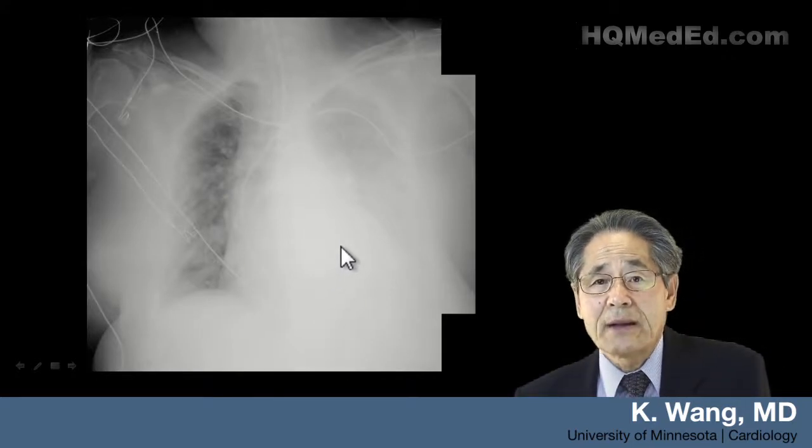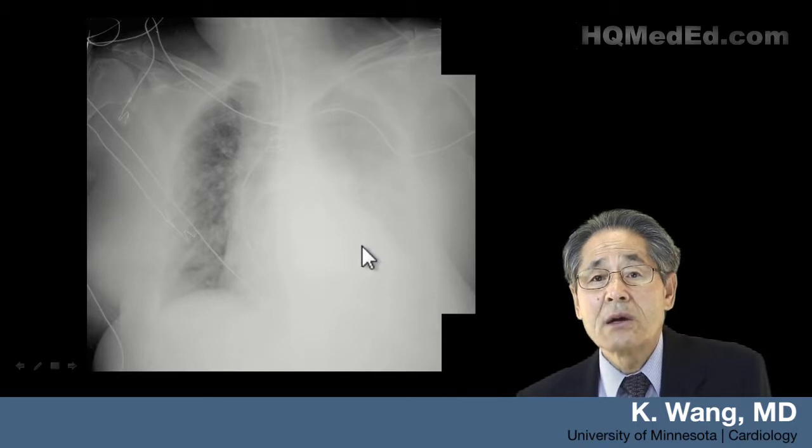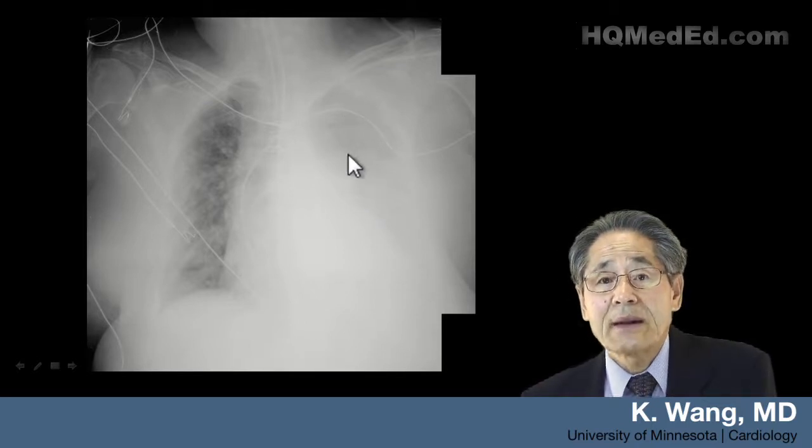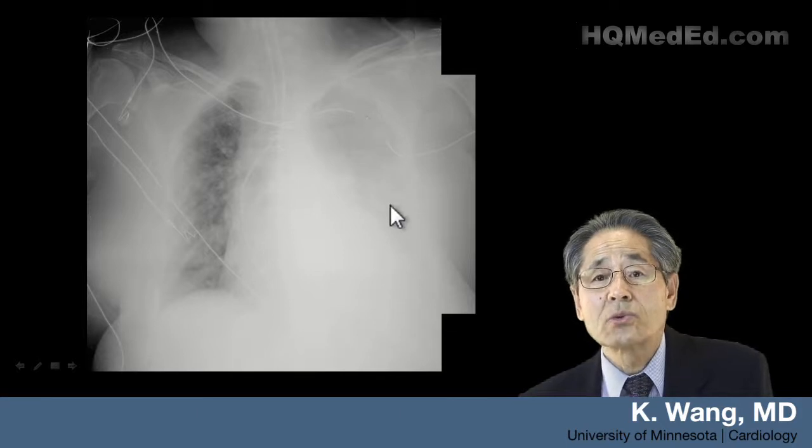Is this atelectasis of left lung? But if you look carefully, there are lung markings going beyond. If it is atelectasis, lung markings shouldn't go there. Lung markings are there, so lungs are not collapsed. So what are we dealing with then?